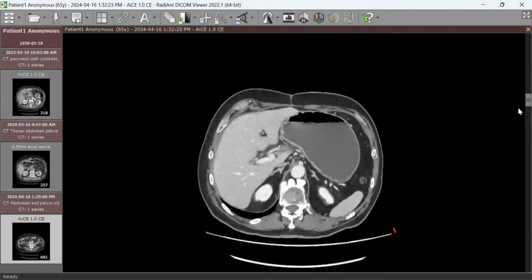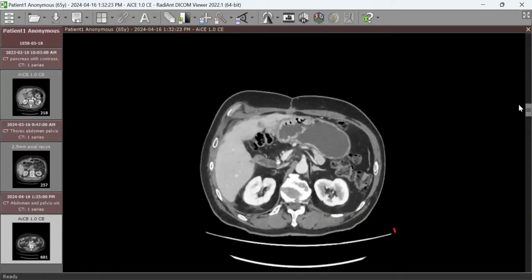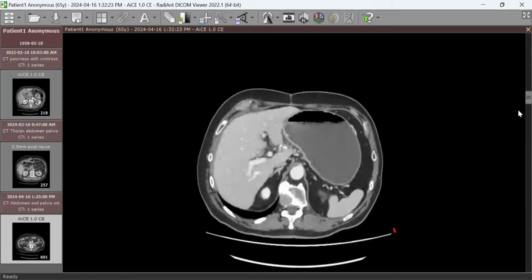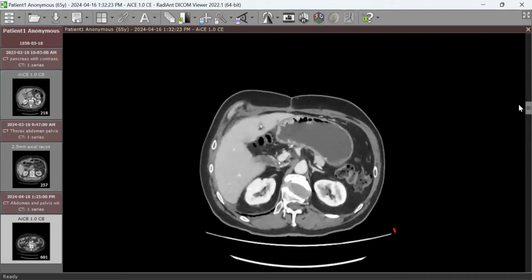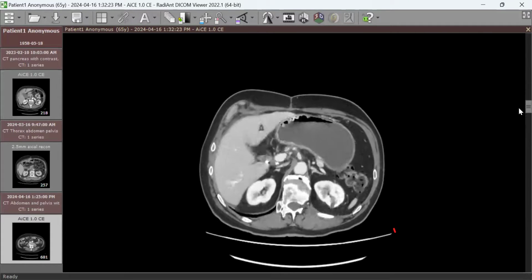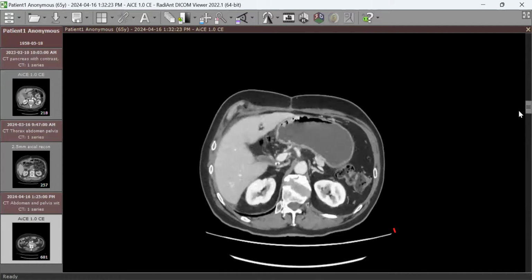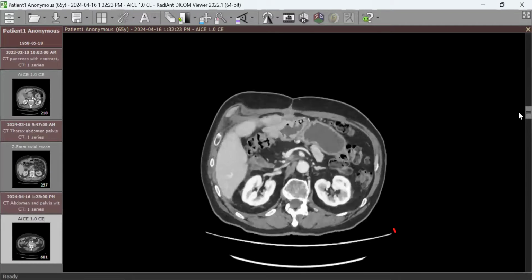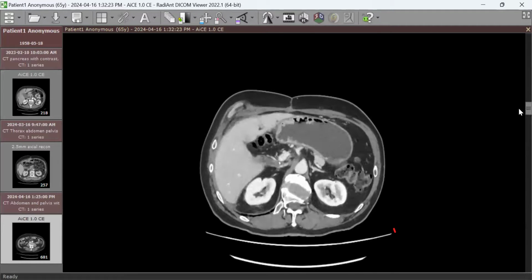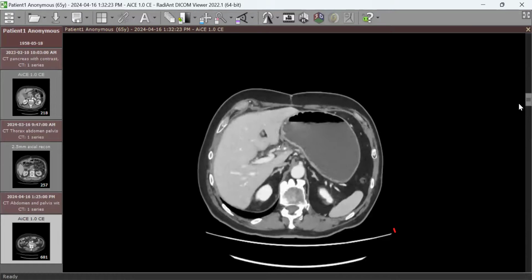Yes, yes. What other organ is not completely present here? The pancreas. Yes. You don't see the proximal pancreas. Do you see the head of pancreas, neck of pancreas? You don't see it. See the portal vein to the confluence? At the confluence, you expect to see the neck of pancreas, right? Yes, and the body, but there's nothing there. And there are surgical clips here, so there's surgery.